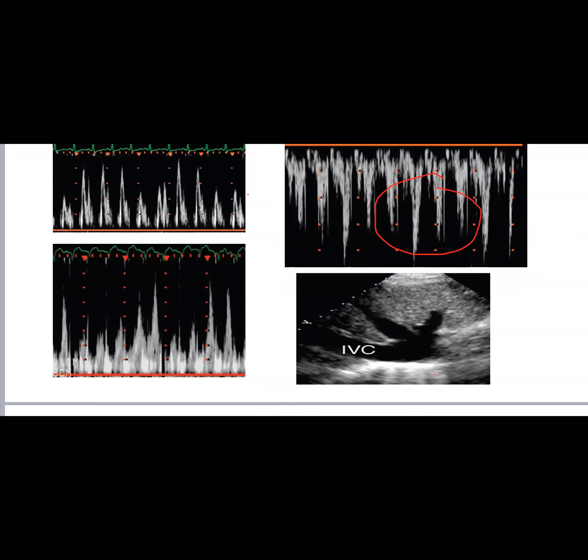Who is speaking? Ahmed. Yes, exactly. I might agree with all of you. If the LVOT signal was not there, it can be constriction, it can be tamponade. But if I have LVOT showing these swings, these changes, no. That is different. Constriction does not cause that.